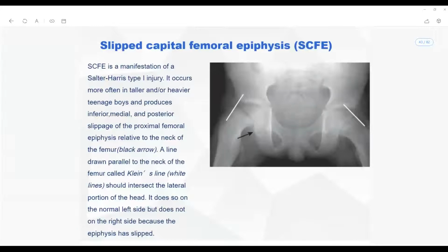Which part didn't you understand, Aman? See, there is nothing related to the fracture part. How do you recognize the fracture here? The fracture is recognized as the radiolucent line. Yes, first thing. But still, this is a young patient, so obviously we can see that there will be no joining of the epiphyseal plate to the metaphysis.